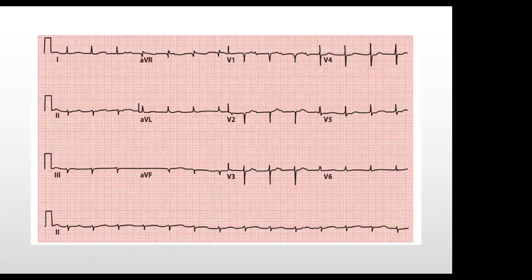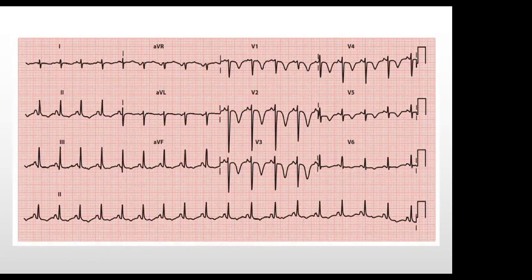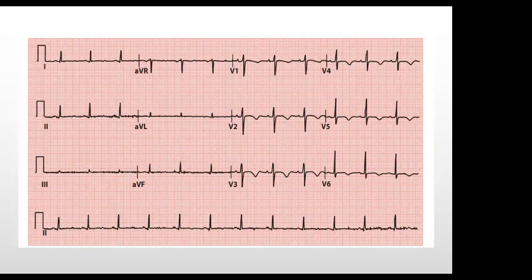Yes, sir. So what do you think is this? I think okay, this is better. Let's look at you. What do you think?